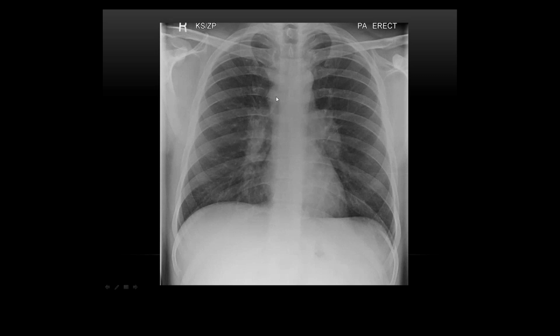Now also, they've got some mediastinal lymphadenopathy. Look, you can see it's widened here. So they've got bilateral hilar lymphadenopathy and mediastinal lymphadenopathy. Any ideas what that might be? Yeah, anything else? Yeah. We've got a third one. Should put a differential in there. So yeah, this one was actually a case of TB. I think this one was just sent to the chest physicians and they did a sputum sample and it came back as positive.